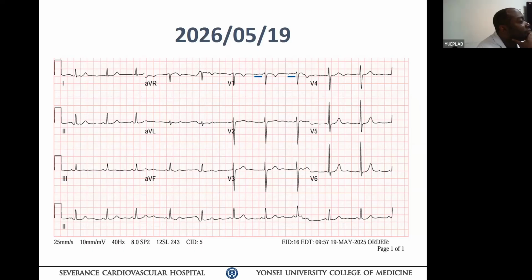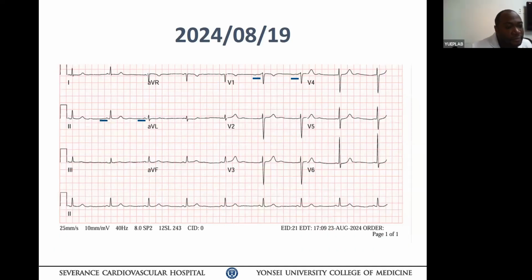But I don't agree with Kofi's hypothesis because the sinus rhythm is coming from the right upper side. So the aVR lead reflects most precisely the sinus node activation. If you look at the aVR, I think there is a negative P wave coming much later. What do you think? The baseline is wavy. I don't know what we can help from that. Can I see the previous one? Previous one, yeah. This one you can see better. Very clean negative P wave in aVR.